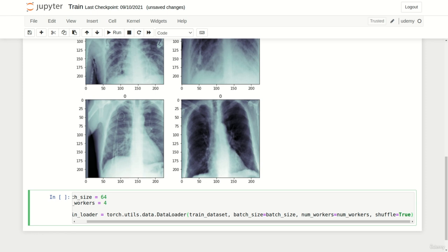Shuffling your training data is really important. Imagine a case where you at first feed 1000 X-ray images that do not show signs of pneumonia to your network. Then the network would simply learn to always predict 0. After that, you feed the next 1000 images to the network, but they all show signs of pneumonia. Then the network would learn to always predict 1.